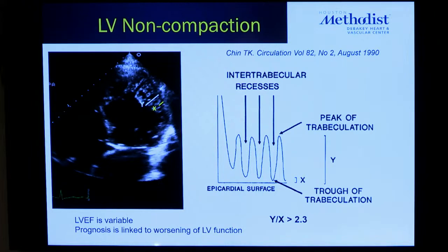You have a ventricle that is dilated, you have a little bit of additional trabeculations in the apex, and the reader throws in the diagnosis. So it's not always something like this, which came out, obviously, this is very, very apparent. So there are situations where you may either overdiagnose it or even underdiagnose it.